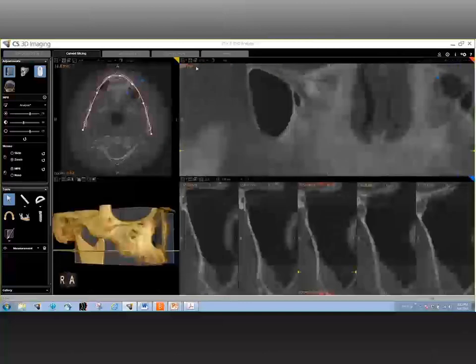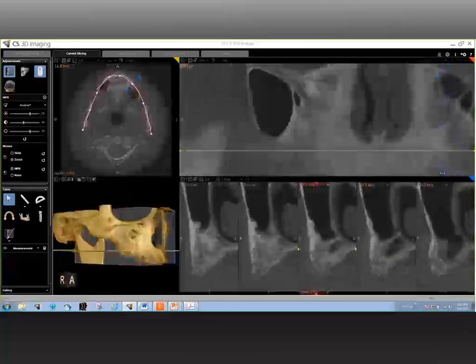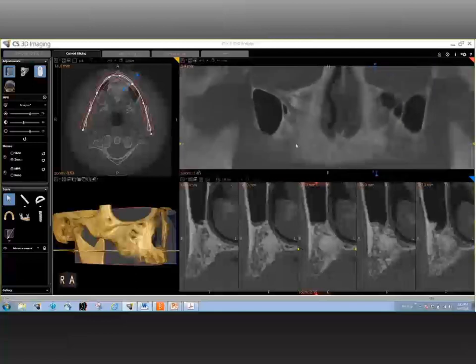Now, if you go to the contralateral, I'm sorry, Jordan. Go ahead. I just noticed something as you were scrolling through there that I wanted to point out. Does the bone look different on the contralateral side? Yeah. Keep going. Right here. You are correct, you have good eyes on that. So that looks like there was some sort of graft procedure done in that area, possibly a small graft, and it seems like the graft is also integrating a little bit. This also shows the importance of having CBCT images for pre- and post-graft procedures, where you can evaluate the area to be grafted, and post-surgically you can evaluate the osseointegration of the graft to the bone by itself.